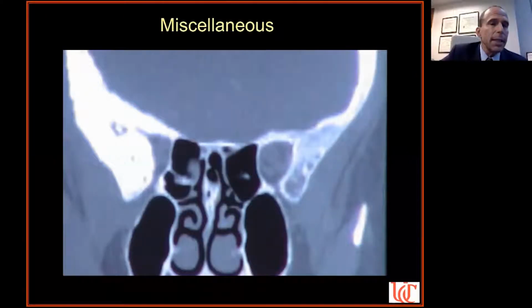This is a CT scan, obviously. You see the nice bright white bone. This person has fibrous dysplasia. So here's the normal looking bone that's been remodeled and so on. Here's a patient with fibrous dysplasia, this abnormal bone deposition. And you can see what this has happened.